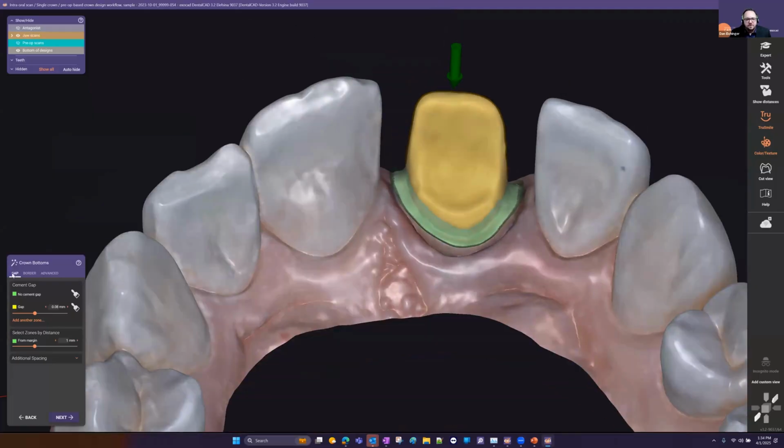There's a lot of configurable options to adjust how the crown's shaped coming off of your crown. For instance, one of the most adjusted ones, I would say, that people I talk to mention is the horizontal offset coming off of the margin.